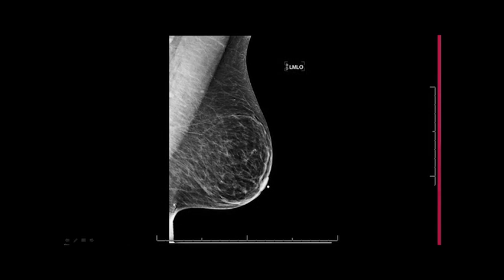I like this MLO view. The muscle is wide, superior, with the convex border down to the level of the nipple. There's a beautiful IMF, and the bottom of the breast is horizontal. Just make sure to have that nipple perfectly in profile, because they would dock you for this. Not that they would give you a deficiency, but they're going to write it on the report. But I do like this image here.